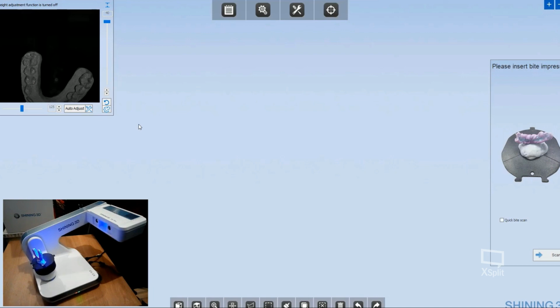I'm working with the version S of the AutoScan-DS-EX Pro series. It means that I can also move the scanner's head by this cursor in order to get its position as the best one for acquiring my object. I'm doing it manually. I can also ask the software to do it automatically, just by setting this parameter.